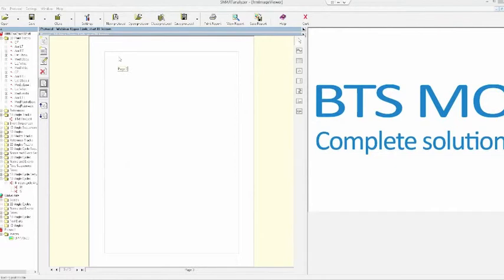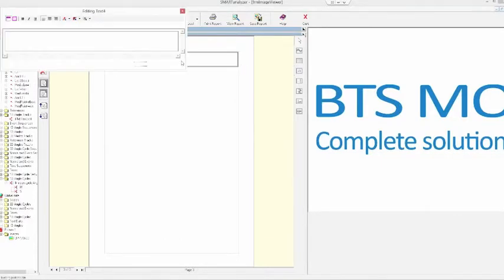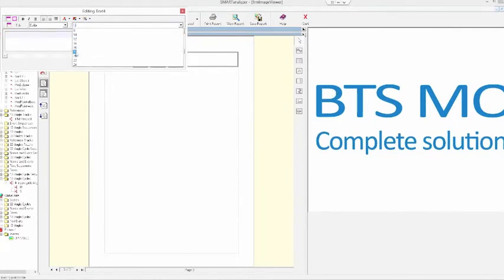Okay, so now let's start creating a new blank page. Imagine that the third page will contain the 3D kinematic results. So we can again add a new title. Again, we can edit the font and the color and so on. This will be the 3D kinematics analysis. Okay.